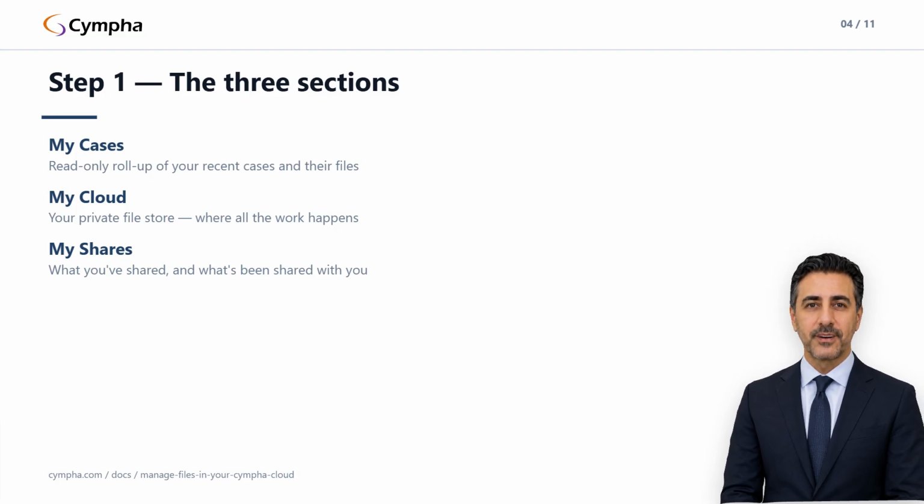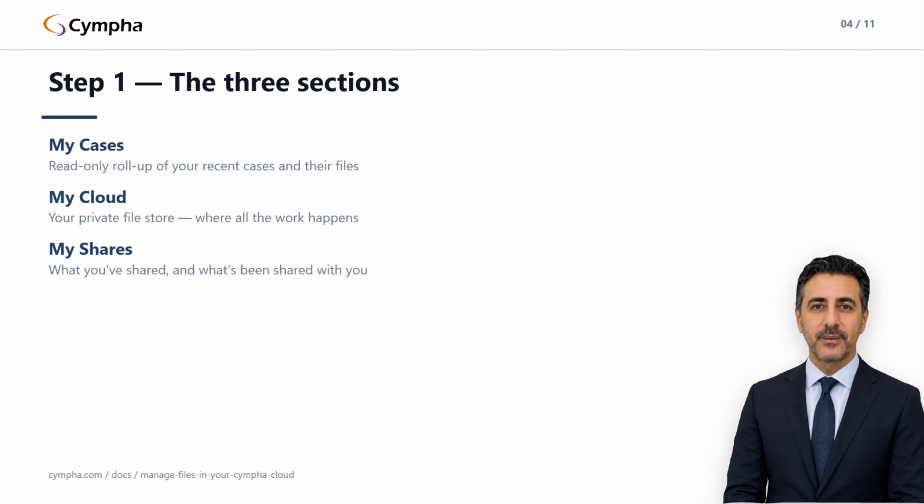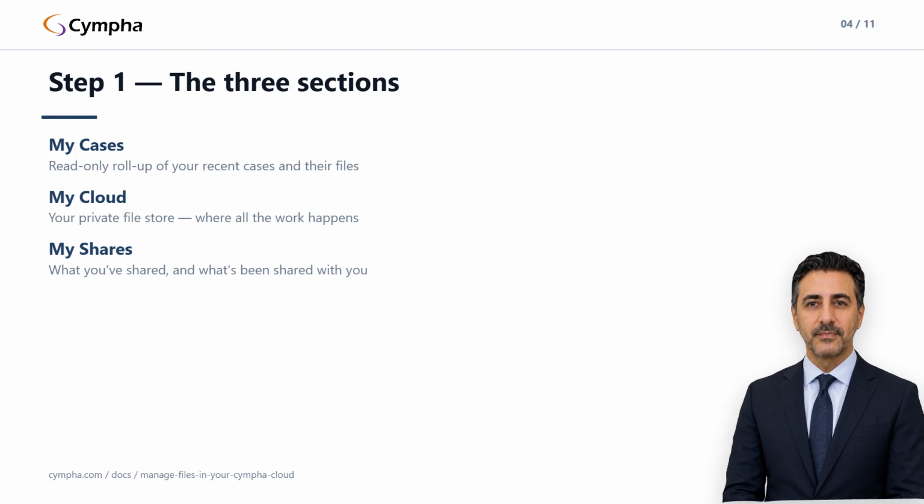Folders nest. Click into one, then click New Folder again to make a subfolder. A folder per patient with subfolders per visit is a common pattern. And keep an eye on the breadcrumb at the top left of the browser. It always shows exactly where you are, and clicking any segment jumps you back up. That matters more than it sounds, because uploads land wherever the breadcrumb says you are.